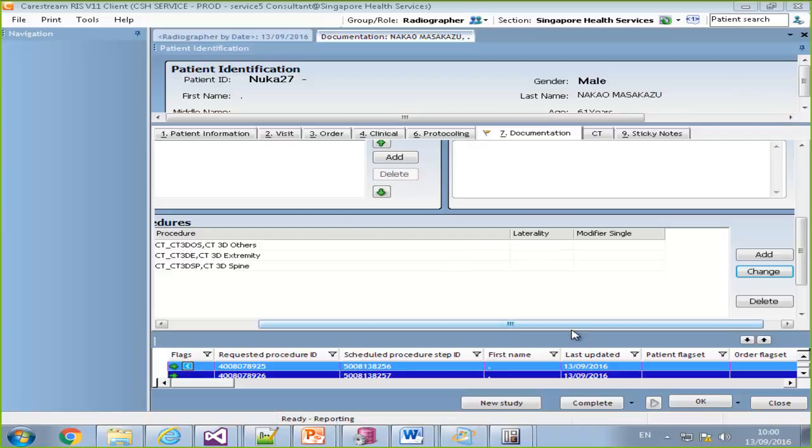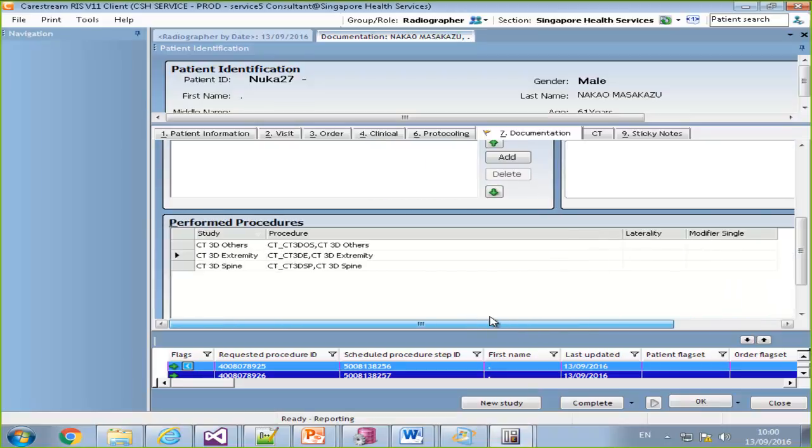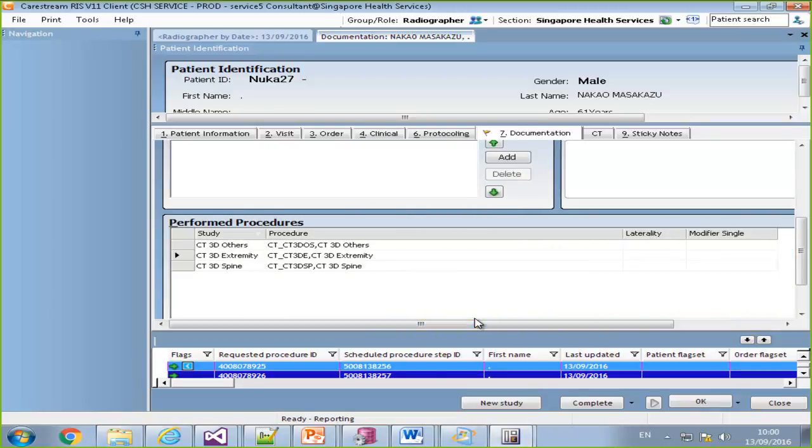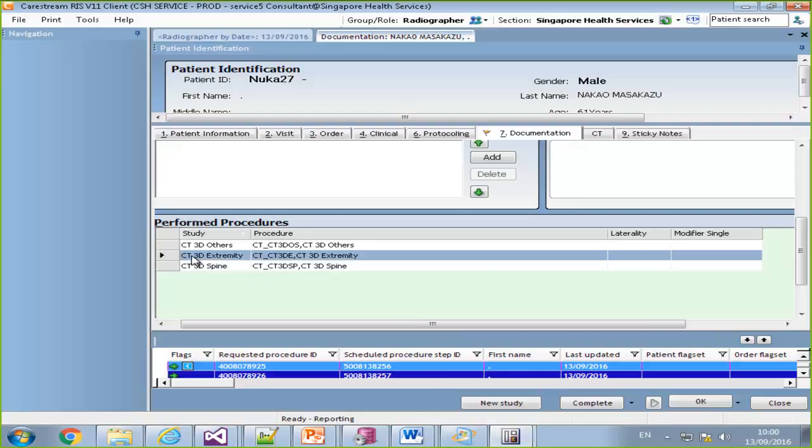Some other thing that we have here is about adding a procedure. I'm not sure, maybe Lee can say what is the motivation of adding a procedure or how common it is. Procedure code, angio: if you want to document the number of runs that they did in an angio procedure, a lot of times I'll use those as separate procedure codes.